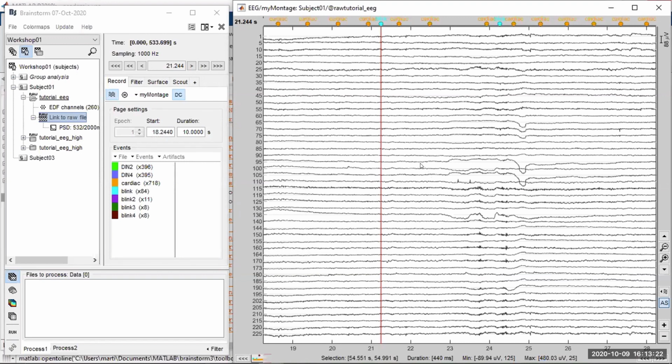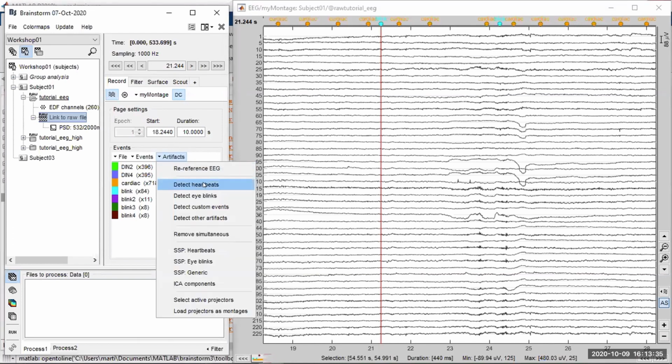If you would like to go through your whole recordings manually, that's always very important. And we want the software to be as smart as possible to save you time when you're doing data quality control. So we have these artifact detection tools for very common artifacts such as heartbeats and eye blinks that can automatically clean this for you, so you don't lose this data.